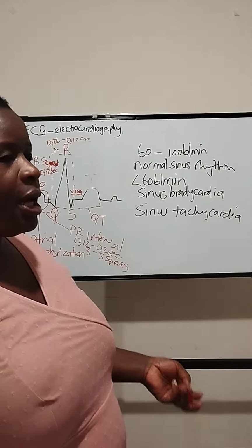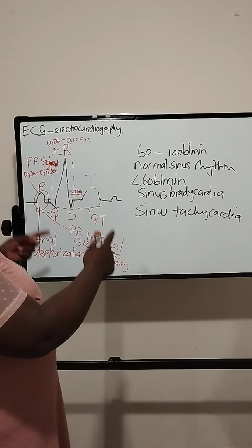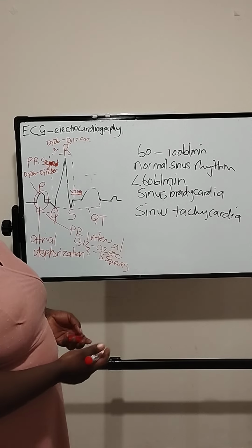So if you are on a monitor, you can also use what we call calipers. They can also help you to find out if the rhythm is regular.